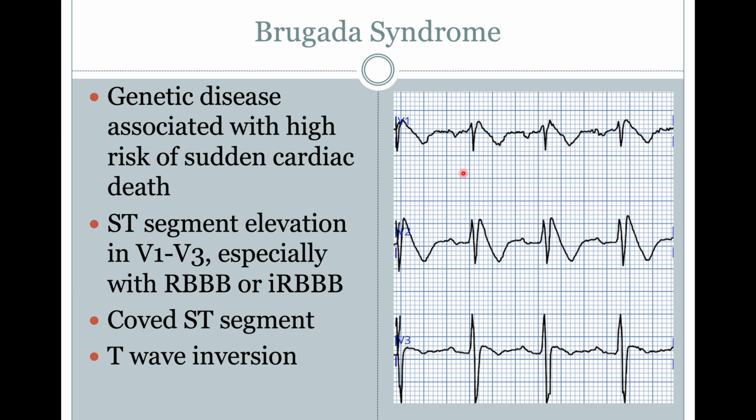So Brugada syndrome is a genetic disorder of the sodium channels. It's a sodium channelopathy. It is shown by a right bundle branch block or an incomplete right bundle branch block with T wave inversion in V1, V2, V3. There's ST elevation, which in type 1 or the main type of Brugada syndrome, to me creates a diagonal line from the top of the second R wave, the R prime wave, to the inverted T wave. And it makes that sweet diagonal line that's kind of identifiable.